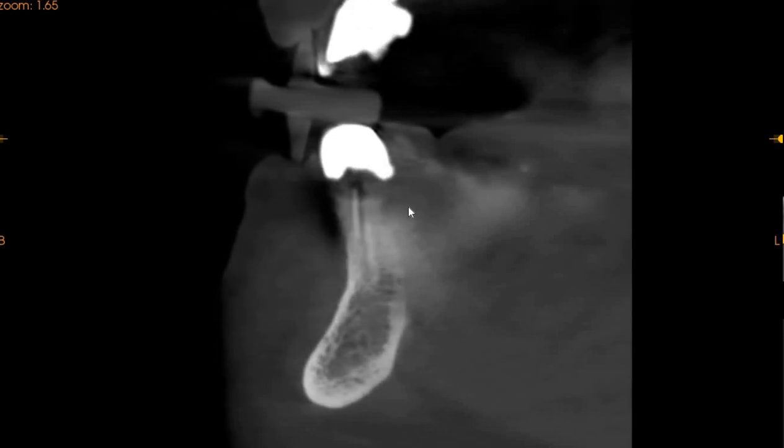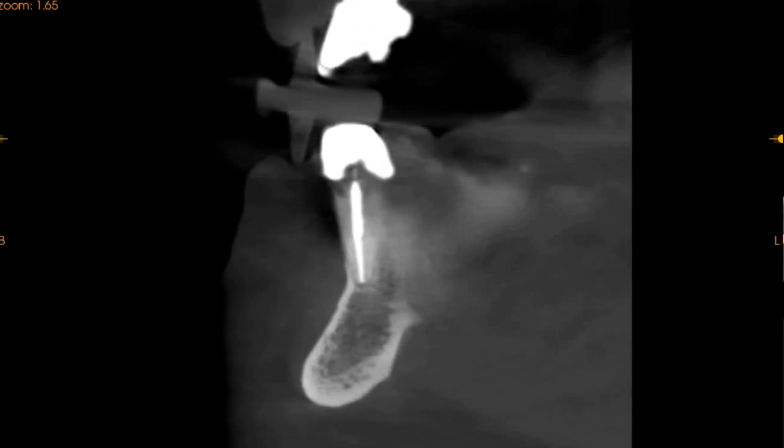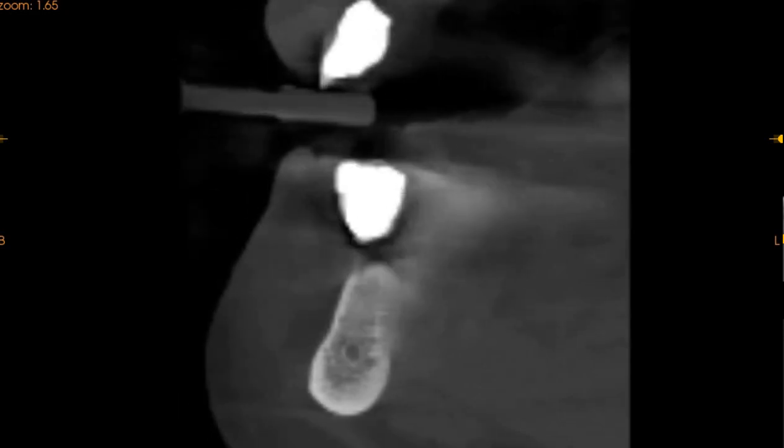Moving to the anterior zone, this is the anterior zone of the patient. The patient has very weak, this is the lateral incisor, very sclerotic canals. This is the central incisor, root canal treated, no periapical radiolucency. This is the pontic on the lower right hand side. The lower right hand side has a 4-unit bridge supported by 3 implants. This is a cantilever bridge. For the mesial cantilever, we can see we've got good adequate bone here, approximately 4 millimeters in width and approximately 9 millimeters in height.